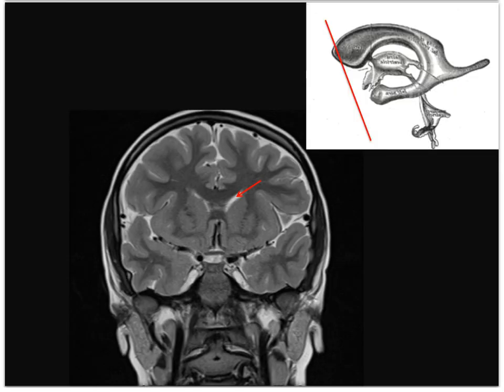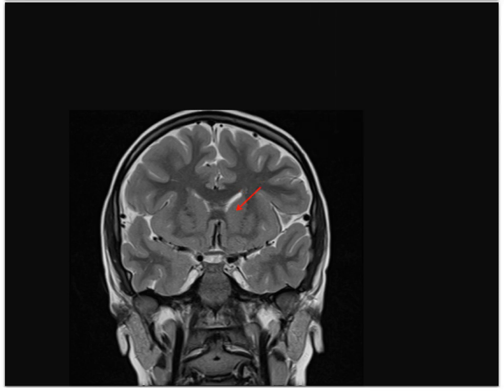Since the ventricular system is coming into view, I've put in a diagram of the ventricles to show about where the angled coronal image is oriented with the ventricles. The frontal horn of the lateral ventricle is shown here. Here is the head of the caudate nucleus. The anterior part of the putamen, and this is the anterior limb of internal capsule, important white matter that runs between and separates the caudate nucleus and the putamen.